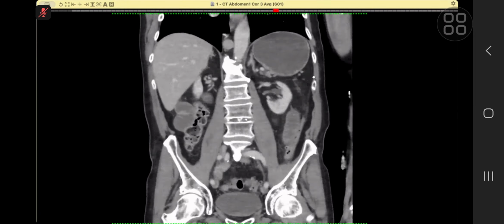area of transitional zone. Here I can see that there is narrowing of the lumen associated with thickening of the wall. I want to inspect this loop in the corresponding axial images.